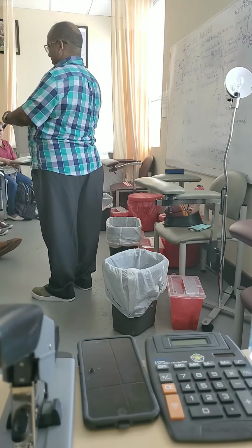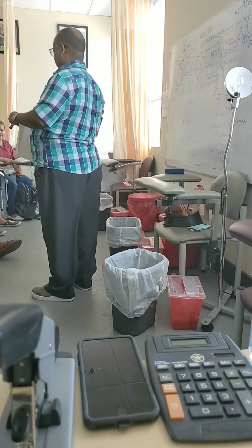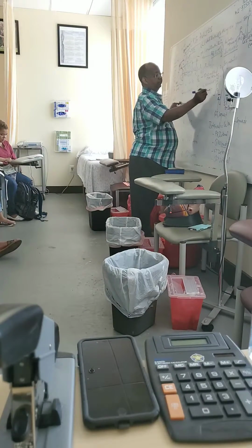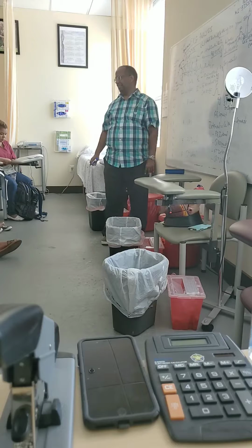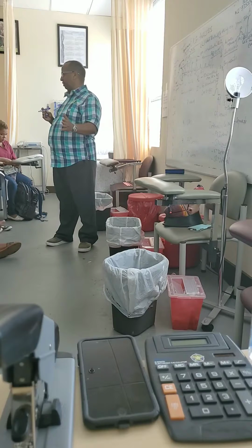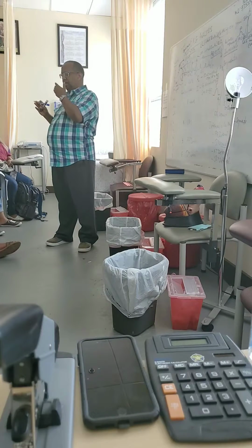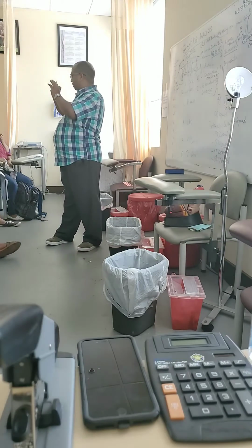So the heart rate will be 60 BPM. You see, you get exactly 60. So 6 times 10 is 60. That is how you determine the rate. If it's regular, 1500, count the little boxes and divide 1500 by it, only if it's regular. If it is irregular, do the 6-second method: count within the 6 seconds how many R waves you have.